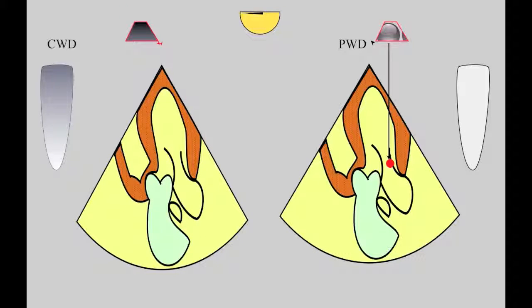Another important distinction to make in terms of physics is the difference between continuous wave Doppler and pulse wave Doppler. Continuous wave Doppler signal samples continuously, as the name implies, and allows the user to detect high velocities of flow. Thus, the area under the curve is filled with velocities at different points along the line of blood flow, and it is demonstrated as a solid signal curve.